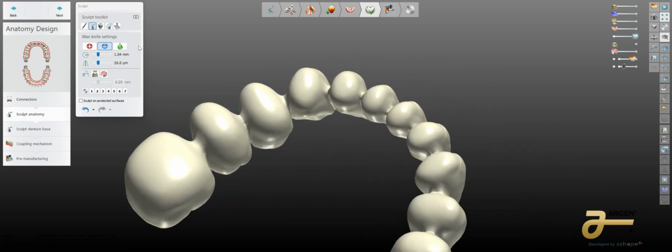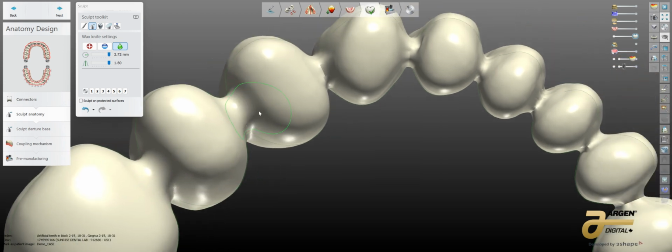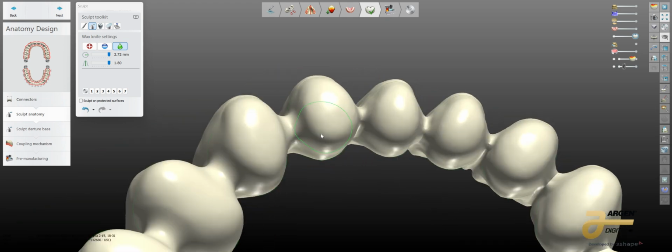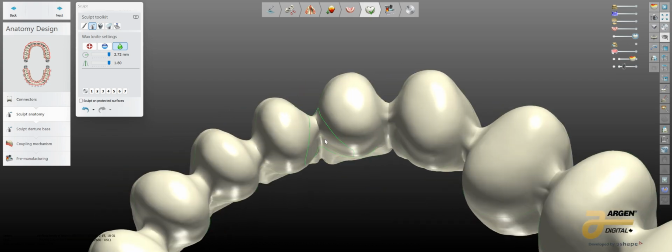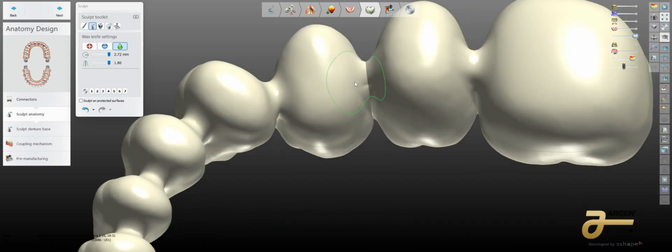And again, my path to make good separations is to come through here and make sure that those connectors are smooth. That really keeps the program from erroring most times. So again, really quickly, just coming through and done.